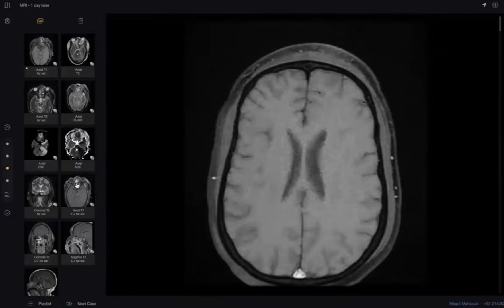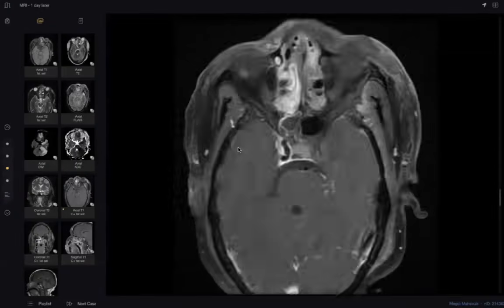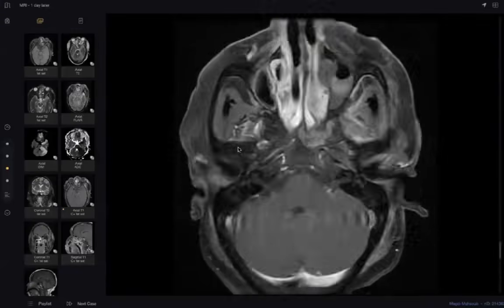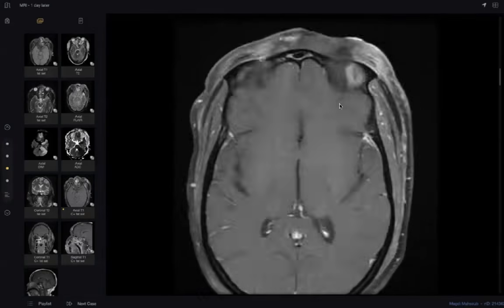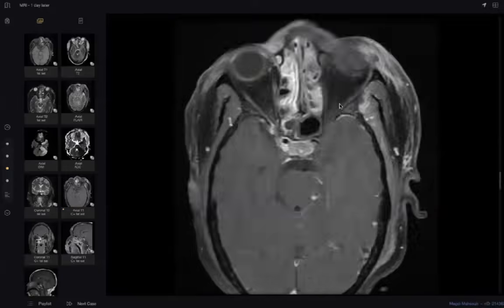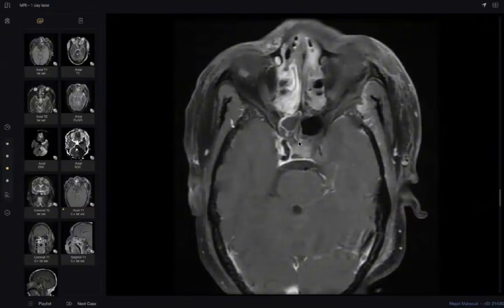After that, you can talk about other findings like thrombosis and infarctions. Also here, you compare this vein with this one, and you will be sure about the superior ophthalmic vein thrombosis, and here also, very obvious. Here, don't look in MRI for the vessels in post-contrast. Why?